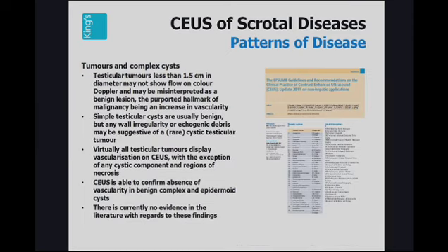Tumors and complex cysts, again, the guidelines have a section which looks at tumors and complex cysts. We've seen earlier that colour Doppler ultrasound is thought not to be sensitive when the tumour is less than 1.5 centimetres. This, however, with the advent of the very high technical components of new machines, may no longer be true. However, the differentiation of tumours from simple cysts with the addition of contrast-enhanced ultrasound and demonstrating echogenic debris without vascularization is a straightforward examination with contrast-enhanced ultrasound.